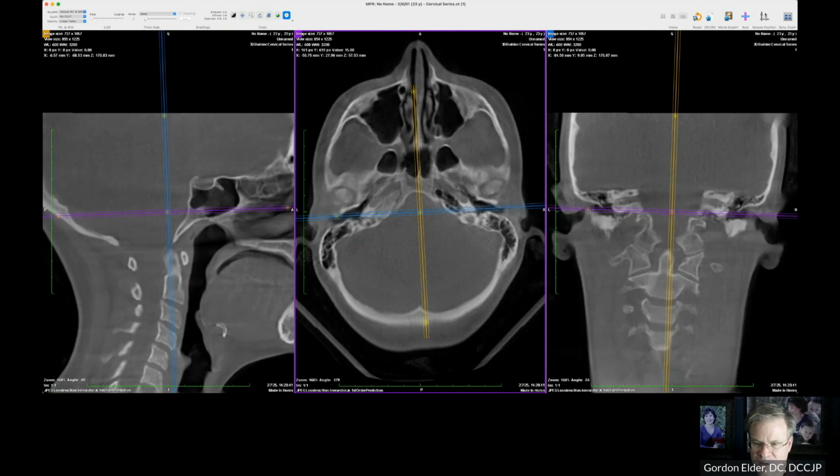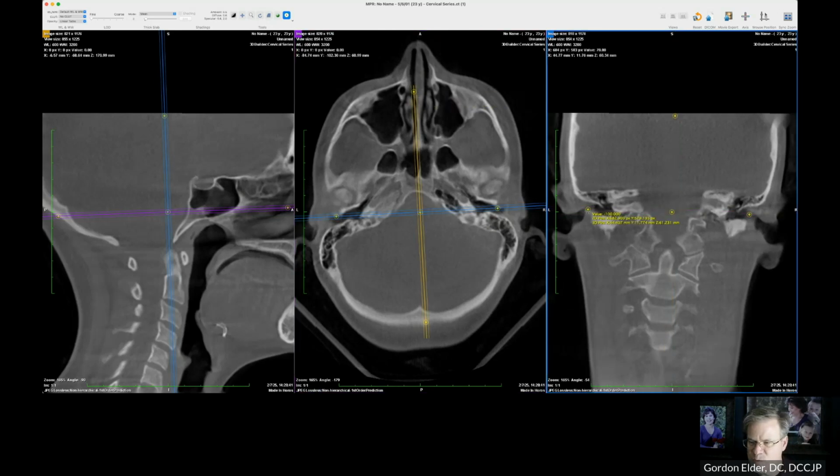We're going to come over here. And then I can hit the space bar. It gets rid of the crosshairs. And I'm just going to click on each one of these. And you'll notice over here, look at this one here, when I click on this. Well, that didn't center. Oh, because it's pretty centered from top to bottom. So this is centering those from top to bottom. And then I come over here, hit the space bar. Now watch that center one over on the far left, how that centers. So now it's centered front to back. So I just click on these real quick.